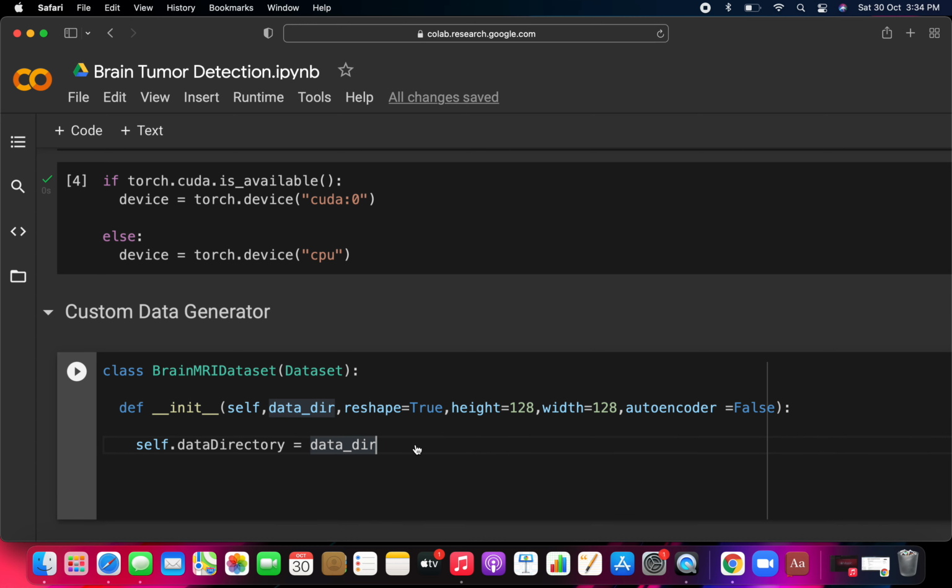And then after, self dot number of class. Even we will define the number of class, and how you will define it: you will not take input whenever you make an object of that. So you don't want to take the number of class input from the user by a different object. Just write number of class, basically with the help of glob you will be able to find it.